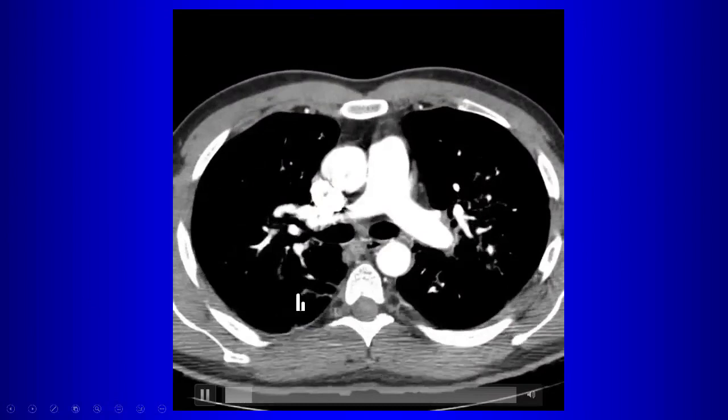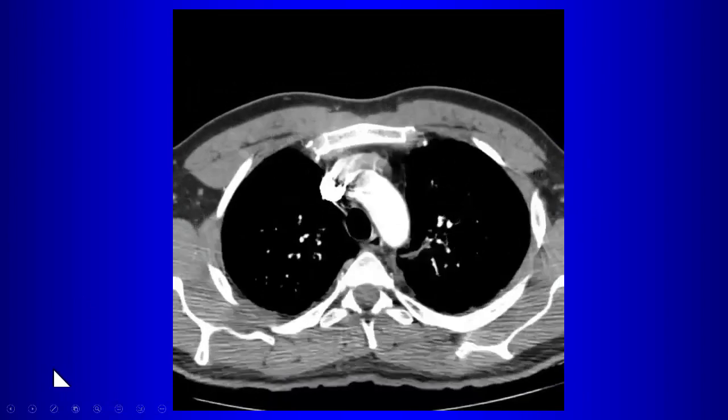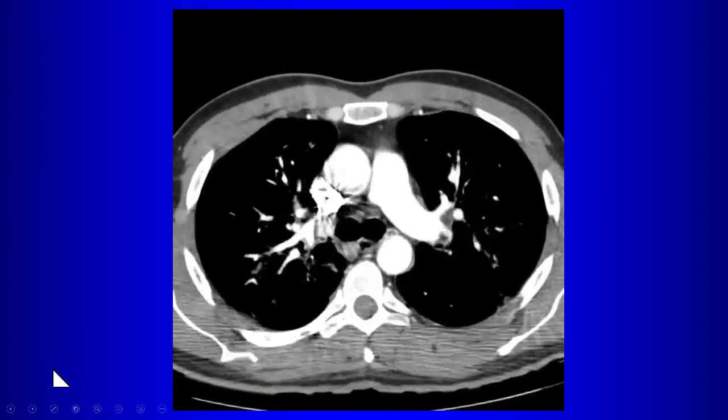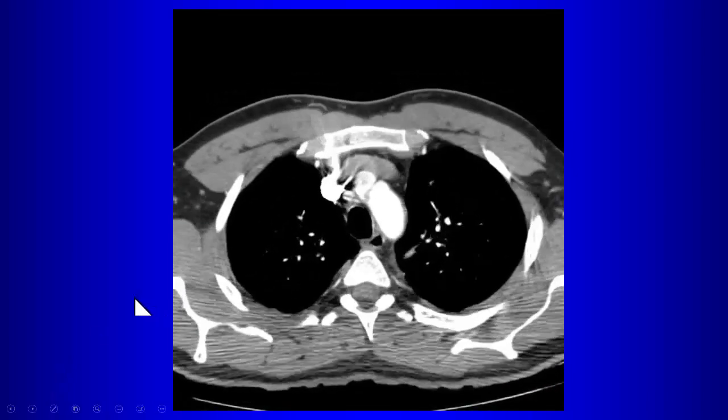And same thing can happen on the right side too. So as we travel up, you want to make sure that you look at all the branches in the upper lobes also. So you don't want to miss. And again, reformatted views. If you have questions, go back and reformat. I like to reformat views myself because the standard coronals and sagittals that you get are not necessarily in the plane of the vessel. So if you do your own reformats at the workstation, you can usually work out if you're questioning any kind of small filling defect within the pulmonary vessel.